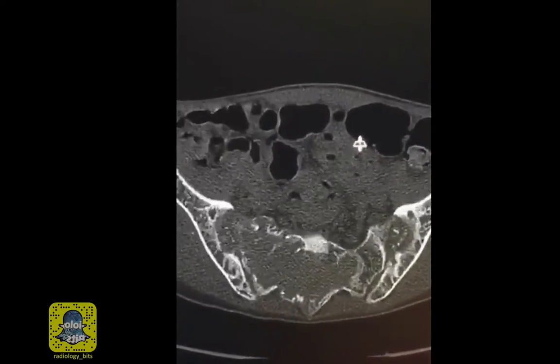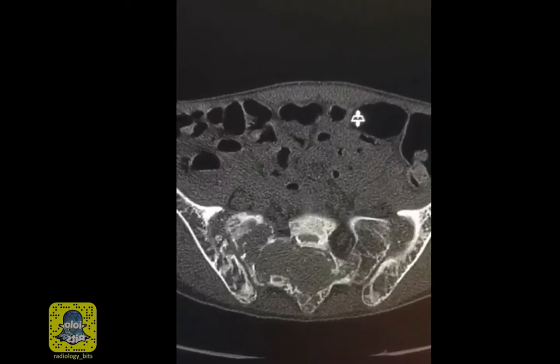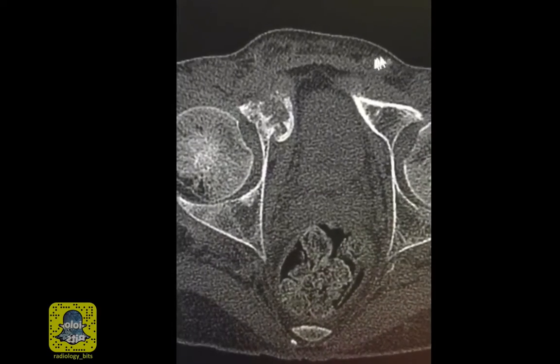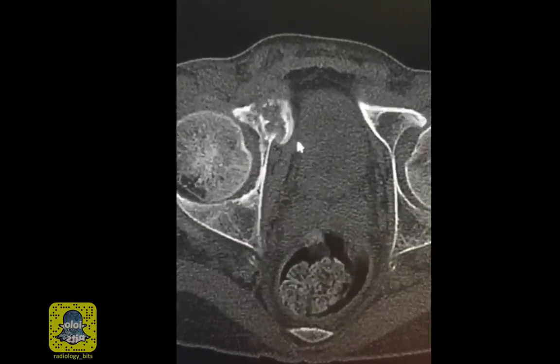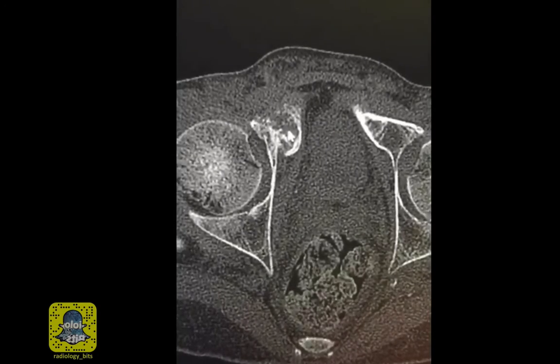As you could tell, this is an advanced musculoskeletal imaging case. Seniors would learn from it, but I think juniors would enjoy it as well. If you're looking for a fracture to explain the pelvic pain, you do have fractures on the right side.